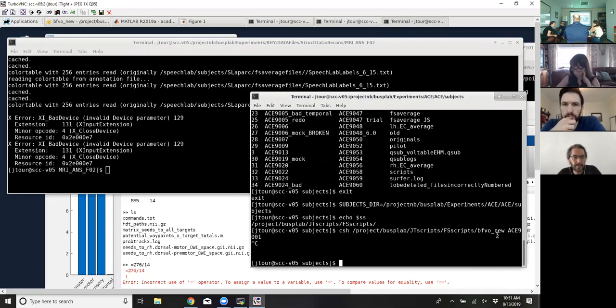Yeah, can we start with just loading it from the preview window? Like loading an individual file. Sure. I think we can do that, because that'll help you understand what the files are, which file type and which file type. Oh, sure. Well, we're going to go through all of that. Ultimately everything we've talked about so far is meant to be a prelude to stuff that's going to be useful for you in the near future. We'll see how far we get in that.